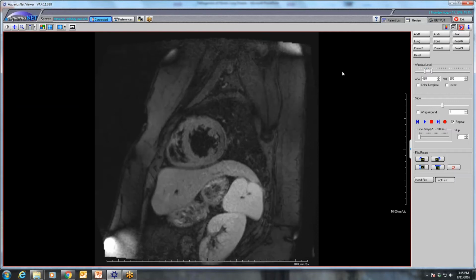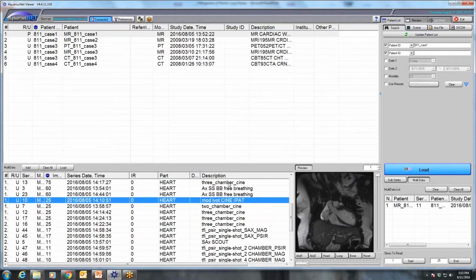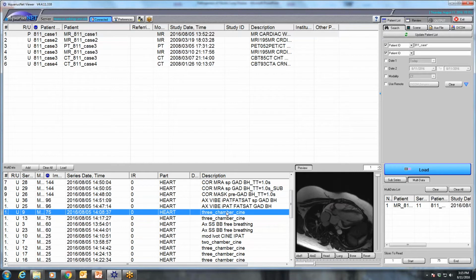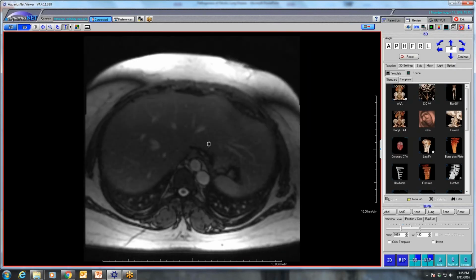I don't know why it's not showing the one where you can see it really well. Anyways, I don't know if there's any known association between foregut duplication cysts and venous anomalies. And we did look, she doesn't have polysplenia. She doesn't have any other congenital anomalies. It's just a weird thing. Have people seen that before? I've not.